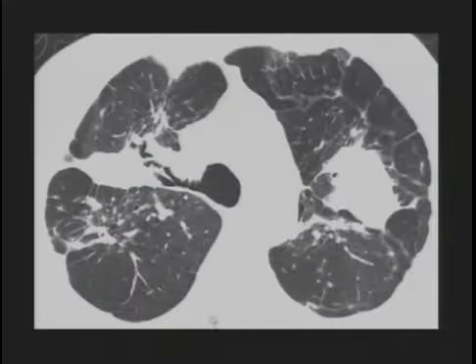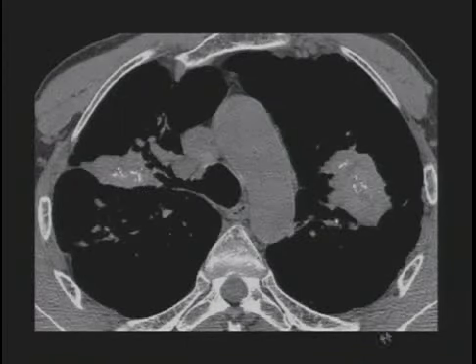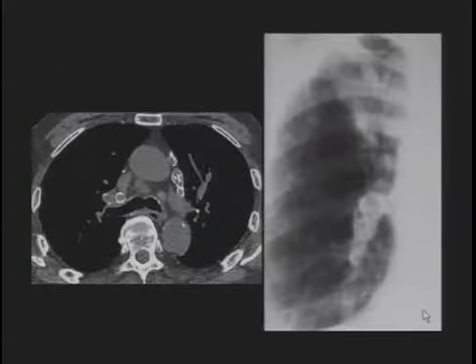Complicated silicosis, and here the CT that could be associated with that appearance. Again, these masses of fibrous tissue associated with traction bronchiectasis in the upper lobes in patients with complicated or progressive silicosis. And here's some calcification occurring in relation to those. So sarcoid and silicosis can appear quite similar in the active stages or in the fibrotic stages.